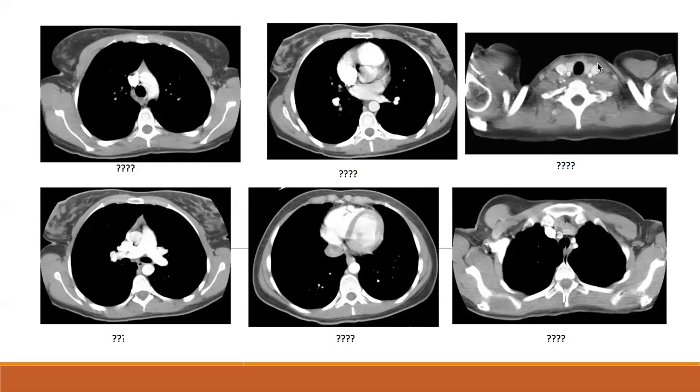Okay, so just below the cervical section, we have just above the aortic arch. So what structures are just above the aortic arch? Those would be the three big vessels that come right off of the aorta. And where are those? Those are right here, 1, 2, 3. So this is the level just above the aortic arch. Another thing to keep in mind is that the apex of the lungs is going to be smaller than the base of the lungs. So that's another really good hint to where you are in the chest.